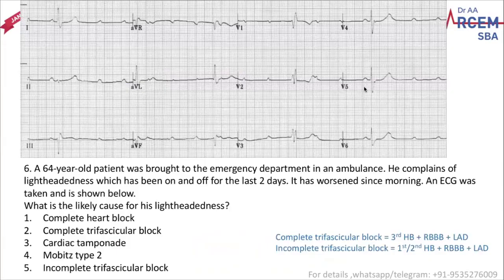Okay, let's go with the next one. A 64-year-old patient was brought to the emergency department in an ambulance. He complains of lightheadedness, which has been on and off since the last 2 days. It has worsened since morning. An ECG was taken and is shown here. What is the most likely cause of his lightheadedness? What is the ECG diagnosis they are asking?